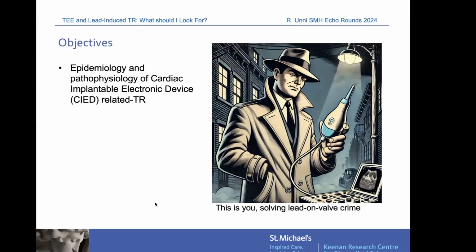So we're going to talk about the epidemiology and the pathophysiology of cardiac implantable electronic device related TR, or CIED related TR. This is one of the terms that you'll see in the literature. We're going to talk about the approach to TEE imaging.